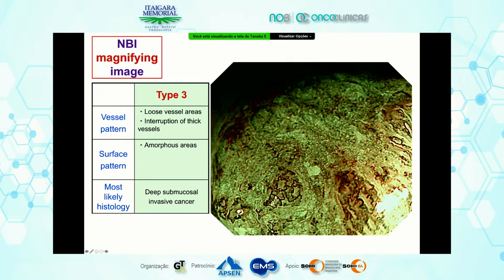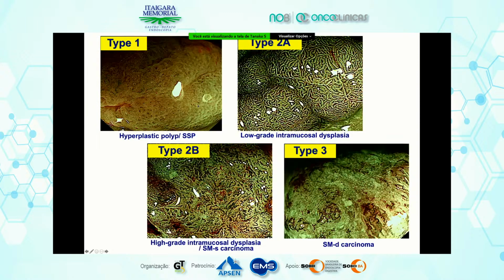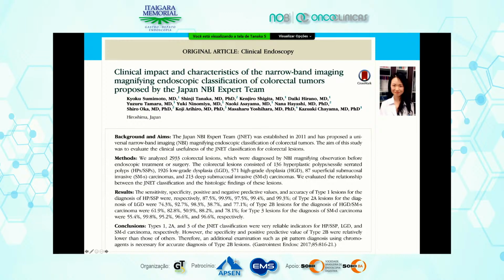Vessel and the scattering vessel. Please see this slide: type 1, type 2A, type 2B, type 3. You can understand this definition. My colleague estimated the clinical significance of the JNET classification.